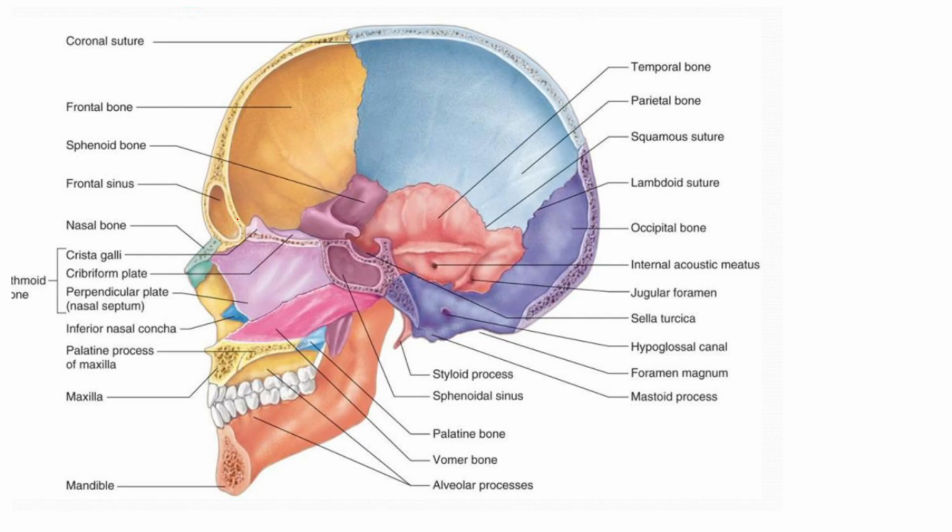Now what we expect to see is the frontal air sinuses, the diploe, the outer table, the inner table, which is more prone to fractures. You can see the coronal suture. Just behind the coronal suture there is a marking for the anterior division of the middle meningeal artery.